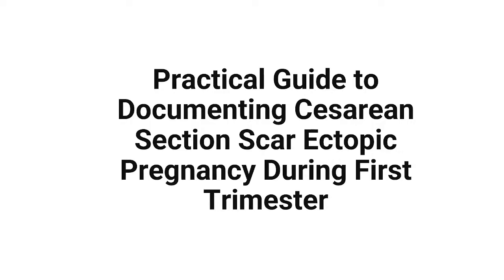Hello, good people. How are you doing? So today we are going to talk about cesarean ectopic pregnancies. Nowadays, because of the prevalence of cesarean sections, the incidence of ectopic pregnancy is also on the rise.